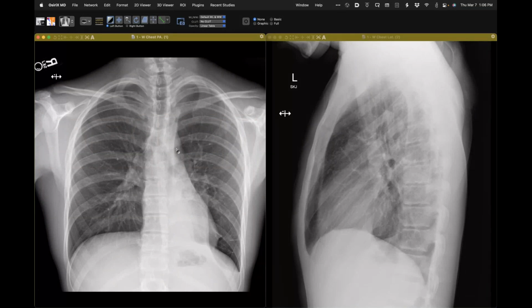So this is an important diagnosis for a radiologist to make, because in my experience, inexperienced trainees and certainly non-radiologists typically do not make the right diagnosis or the right observations. So here they are, frontal and lateral. There is abnormal opacity, and the corresponding opacity on the lateral projection is posterior.